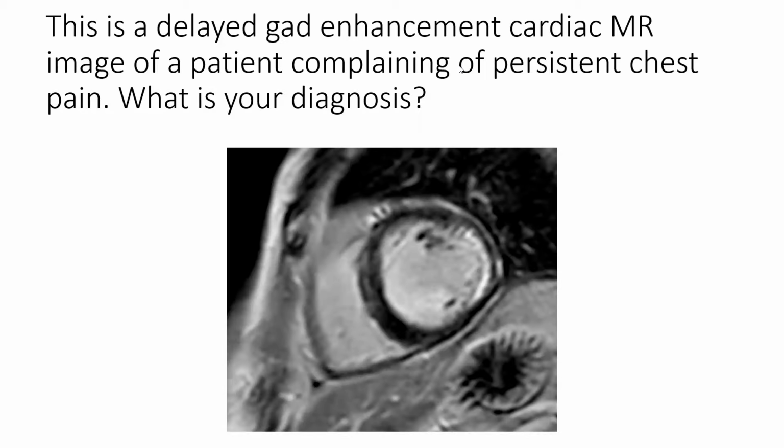Let's go to the picture once again. So this is an image. So what do we see? There is late gadolinium enhancement in the lateral left ventricular wall, right?